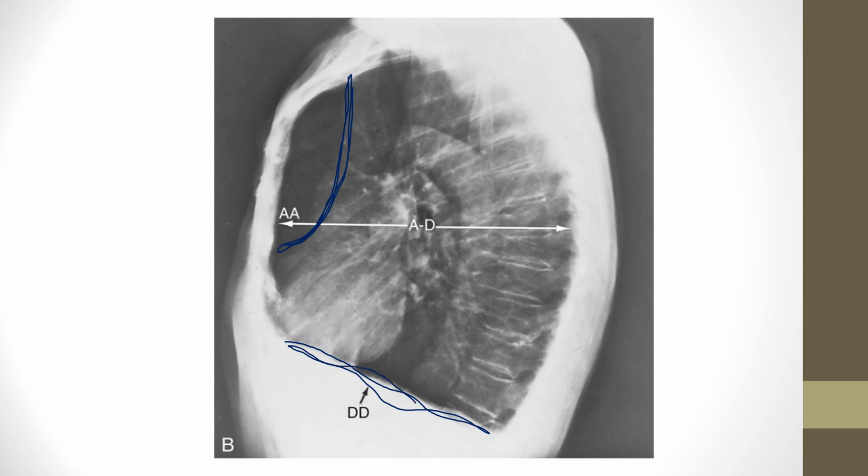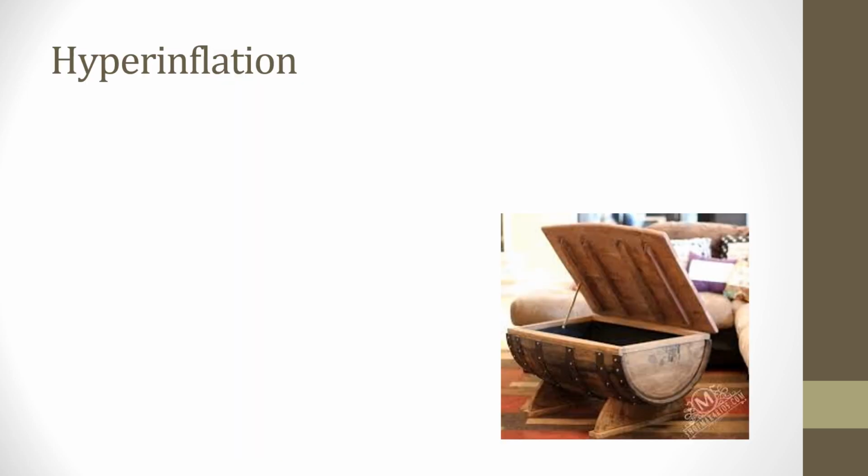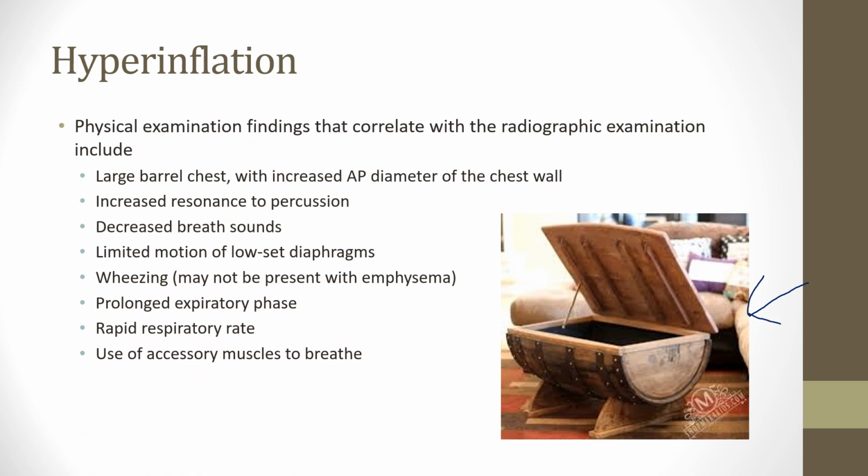Poor depressed diaphragms. They should cheer up. Hyperinflation, do you like how there's a barrel chest there? Little RT joke.